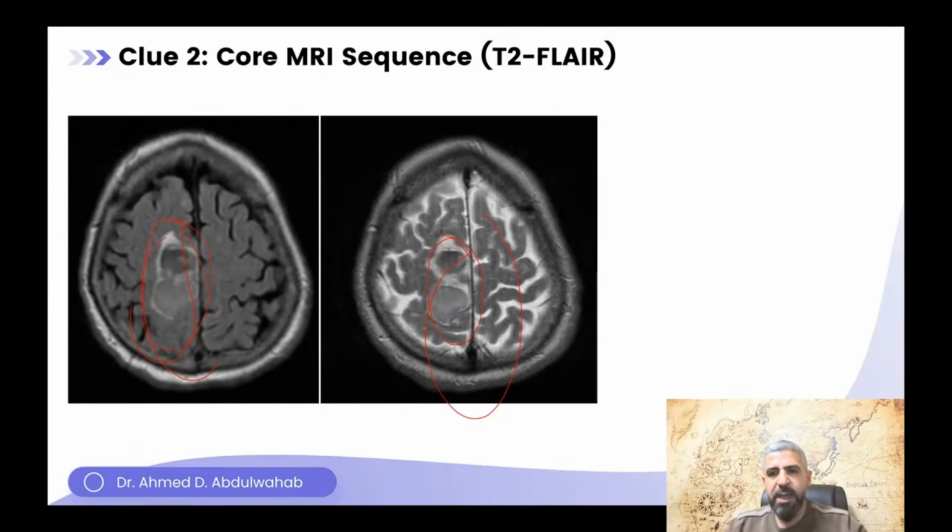So now, is this hemorrhage? The final clue. I'll give you one more clue and you have to decide. What will you do next for this patient?